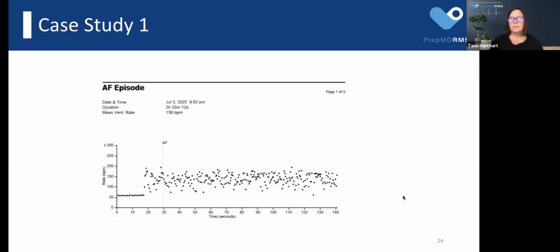In addition to this AFib episode, which was 2.5 hours, this patient also had 4 tachy detections that came in on the same day at around the same time. So I looked at all of those. In addition, you could see that the tachy episodes were AFib with RVR.